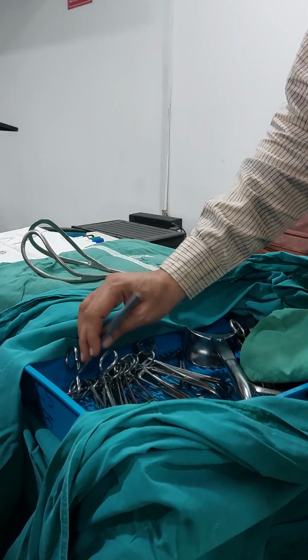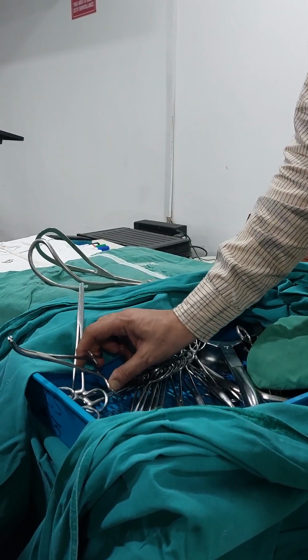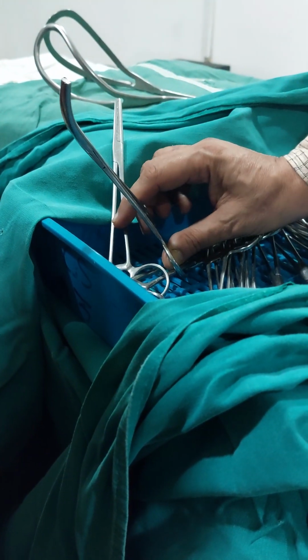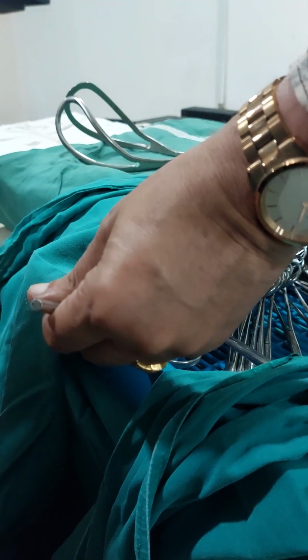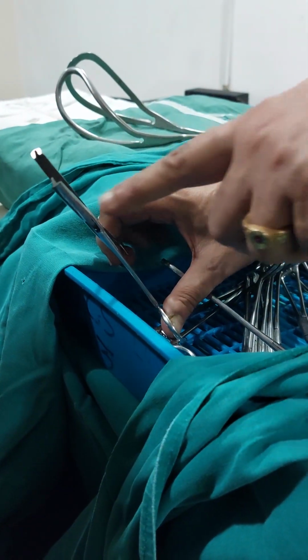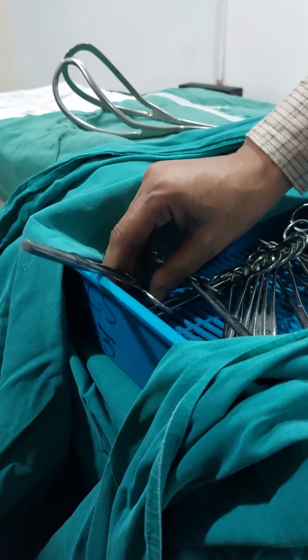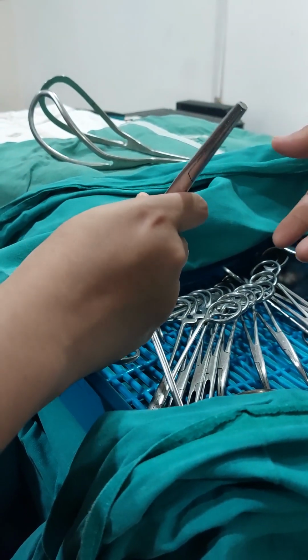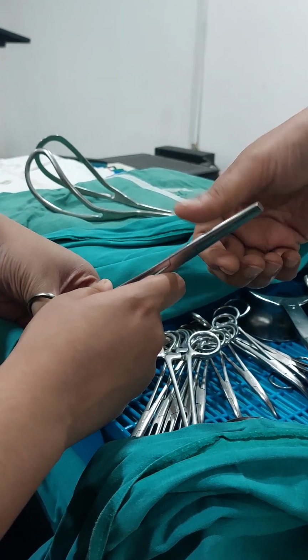Okay. This is a hysterectomy clamp, also known as a curved Kocher clamp. It has a tooth here and a tooth here. This is a curved one and this is a straight one. The difference is that it is curved and this is straight. On the mouth there will be one tooth. A hysterectomy clamp. It is used in hysterectomy operations and can also be used during delivery when you are clamping the cord. The umbilical cord is clamped with this.